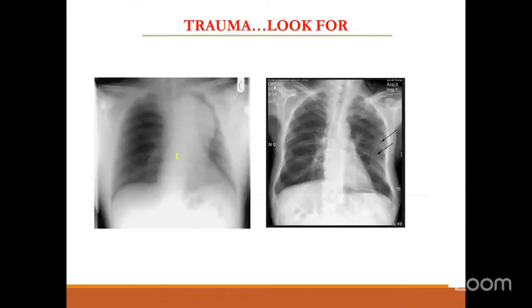So this is a patient who presents to us with trauma. The first X-ray, what is it showing? The lung on the right seems to be okay, but the left lung, there is opacification. But there is a clear border arising out of the opacification. There is no loss of silhouette between the lung and this shadow margin. It is clear. So what is the normal structure which is present here?